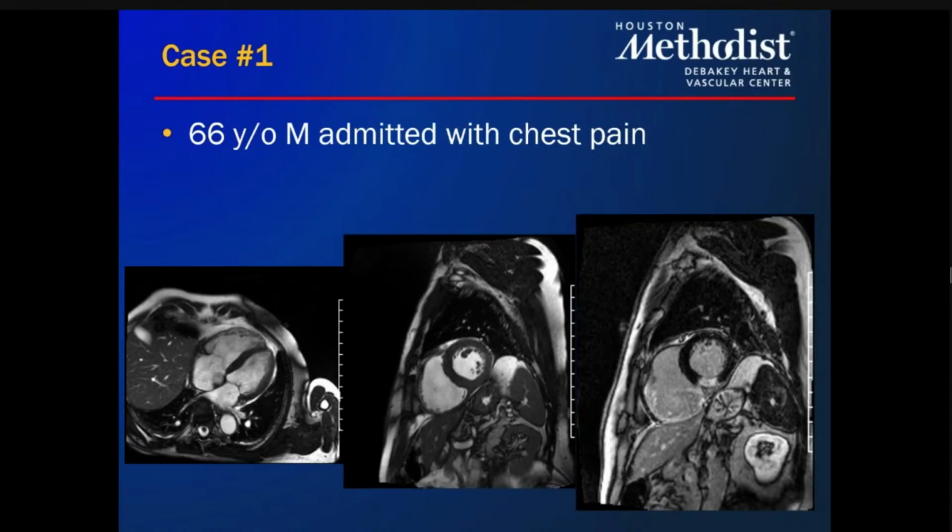Yes. And how about the LGE? I'm sorry, and then the LGE, the RV has actually LGE, I just started looking at it again. The RV has LGE all the way as well. So the inferior, and then the lateral wall also, the bottom lateral, I should say, on the image. And then the RV looks bigger than the LV, at least on the 4-chamber, with some decreased function. The LV function looks okay. Thickened mitral valve, at least. And then tricuspid, there's TR for sure, and the RA is big.